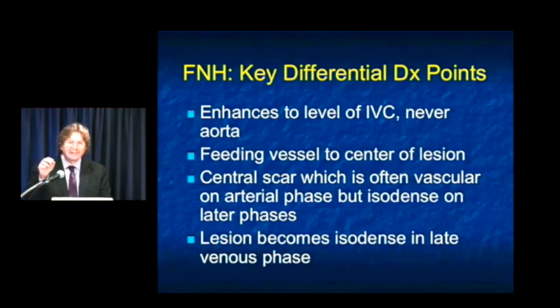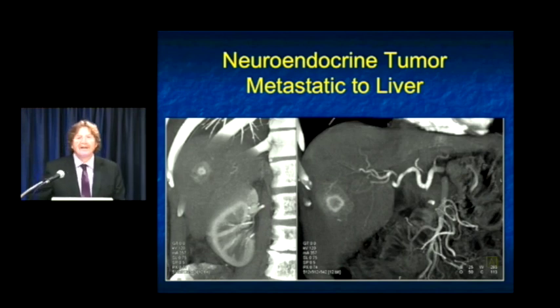We look at enhancement levels. We're looking at the vessels. We're looking at the central scar. We're looking at behavior. And you would not confuse that lesion with this lesion. Here's an enhancing lesion. This is not a hemangioma.